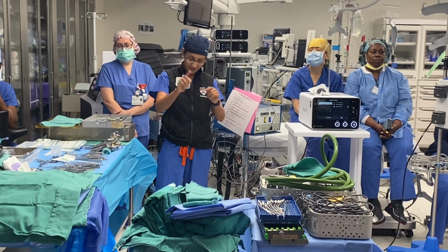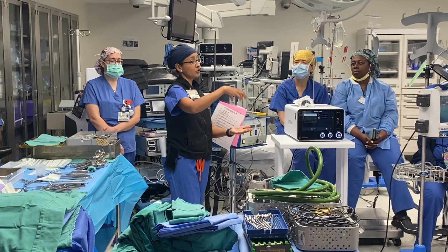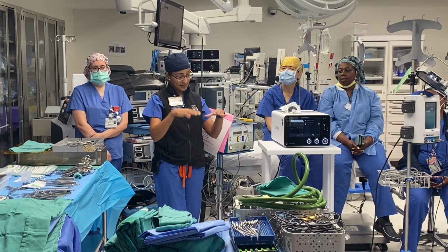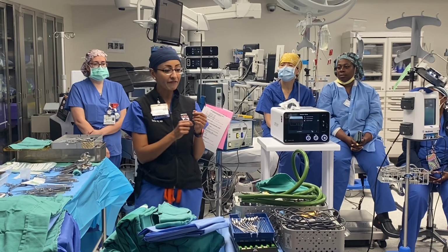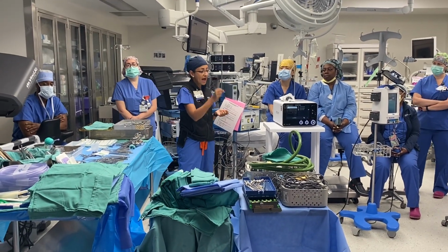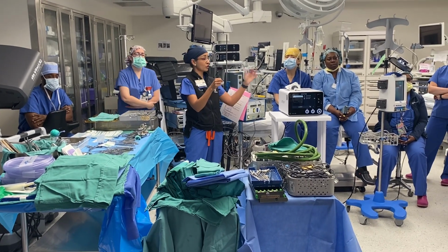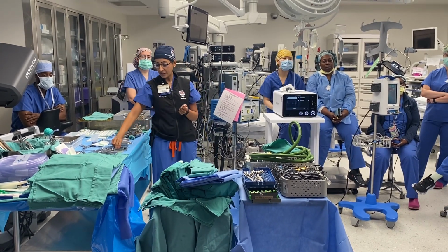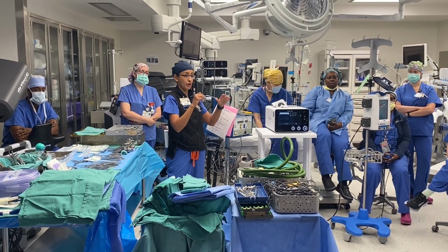And then, again, back to opening up the dura. So once the dura is open, if we are doing a cranial tumor, abscess, whatever, at this point now we're going to need to go inside the brain. So often we're using things like the Stealth navigation, which has a blue wand, you'll hear us ask for. And that allows us to localize where we want to go. And so the first step there is what's called a corticectomy, okay? Corticectomy means we're going through the brain, okay?